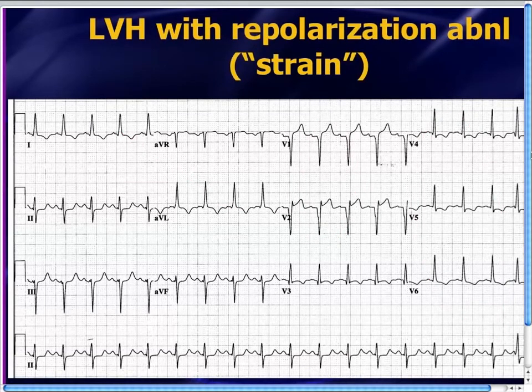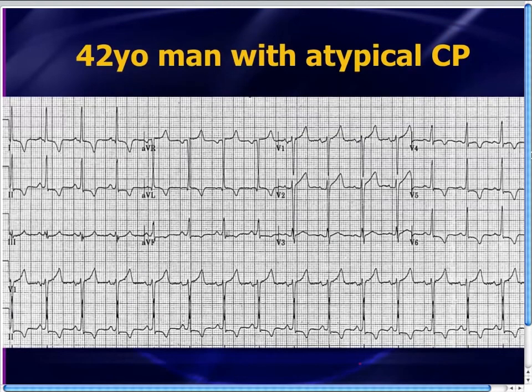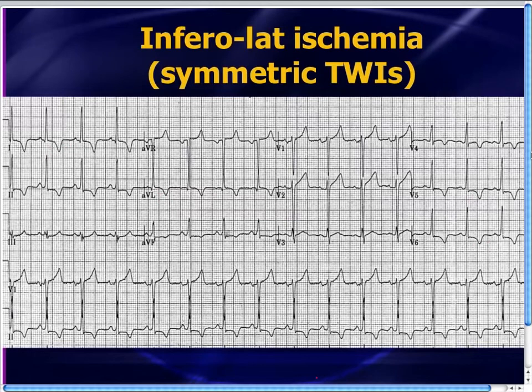All right. So this is a really difficult diagnosis to make. There should be no doubt about that. Now, take a look at this. Okay. In this particular case, the patient has LVH. The R wave in aVL is greater than 11. And there's flipped T waves in 1 and aVL, but these flipped T waves, you'll notice, tend to be more symmetric in appearance, okay? I don't know if my drawing is helping or making things worse, but take a look at how symmetric those T waves are. Those are not typical for strain flipped T waves.